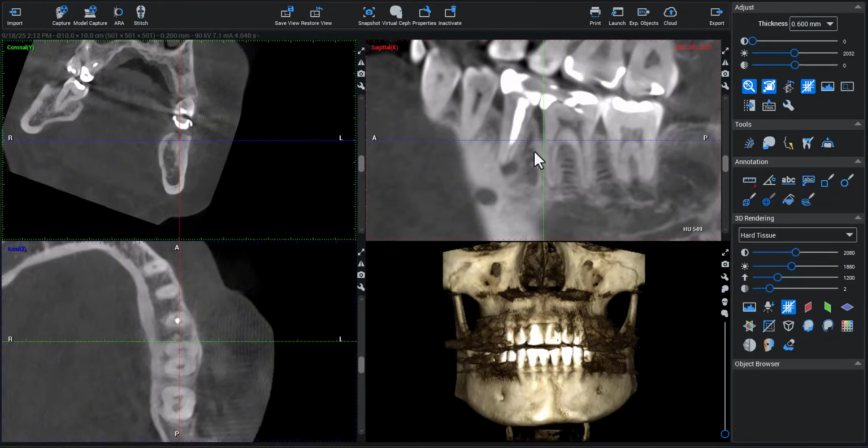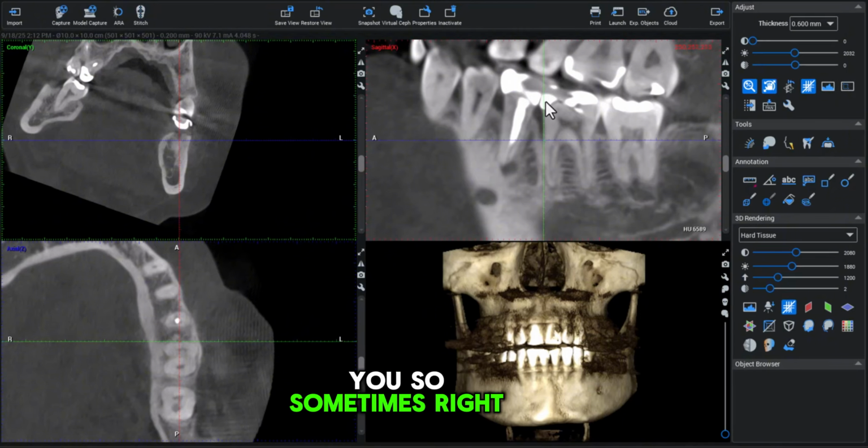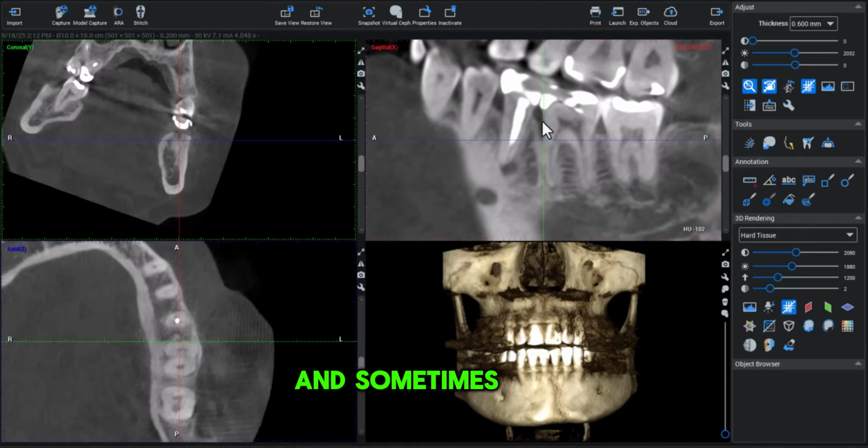If you're watching this and you're not a dentist, I'll explain how the bone loss happens at the fracture. This tooth has a history of some restorative work, fillings, and been in occlusion. The patient's at least in her 50s, maybe early 60s, so she's been functioning on this tooth since she was 6 years old. Sometimes right here on the chewing surface of the tooth, you start to develop a crack, and sometimes that crack will propagate down the tooth.